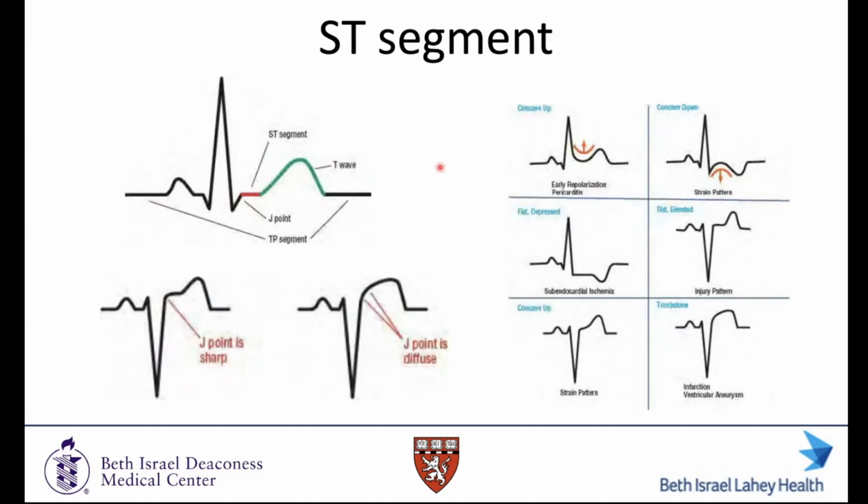And then when you have these ST depressions or elevations, they can either be flat, like they are over here, or they can have some concavity to them. And these patterns can represent different pathology, which we won't get into today. Jason, any other quick tips for basic ST changes? No, all these are really good patterns to recognize, and I think you're right. I think it's best to go into these in more detail in a dedicated session.